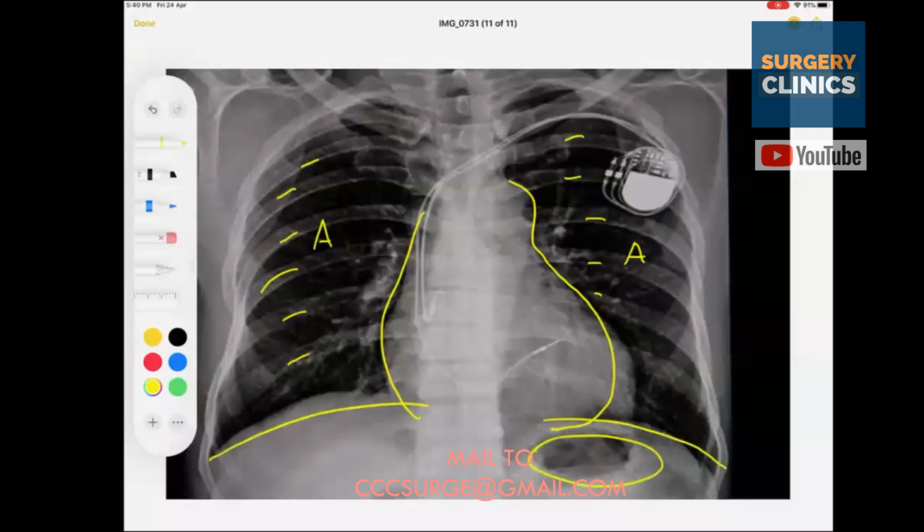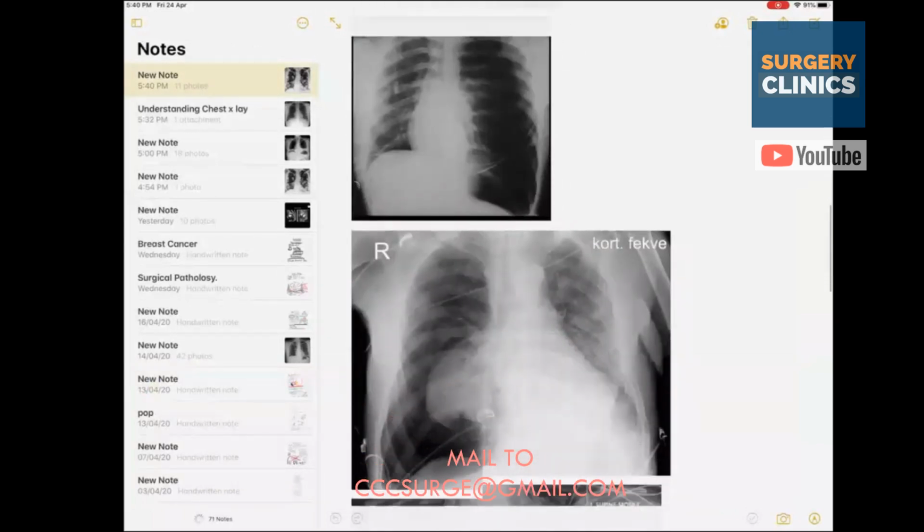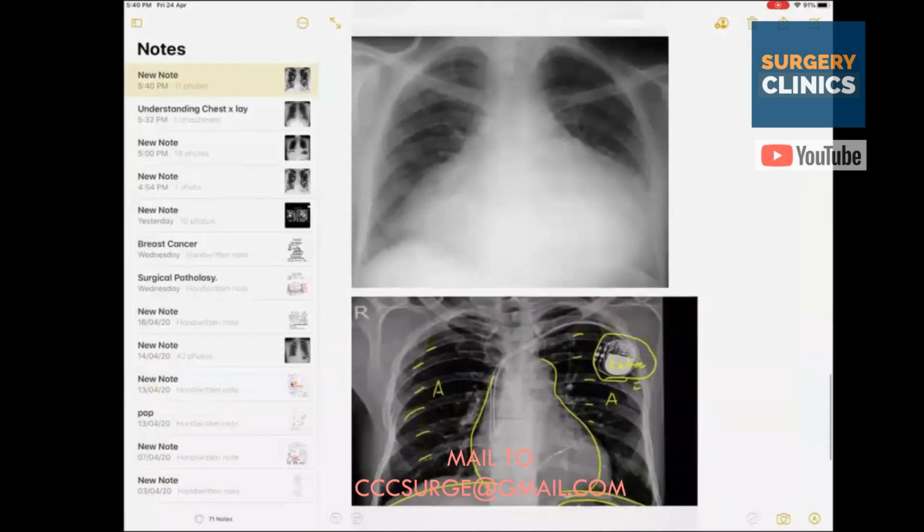Okay, what is this one? It is the stomach shadow. Okay. And what is E then? Sir, the E is the extra. So this is something. Okay. So this completes this one. Now, if you have looked into this, tell me if you have understood up to this.